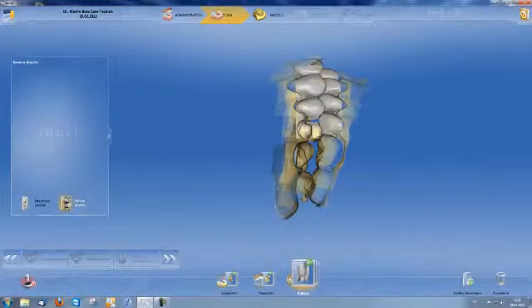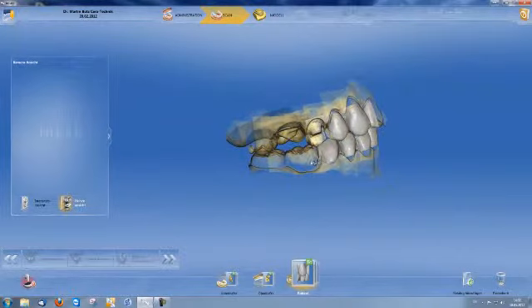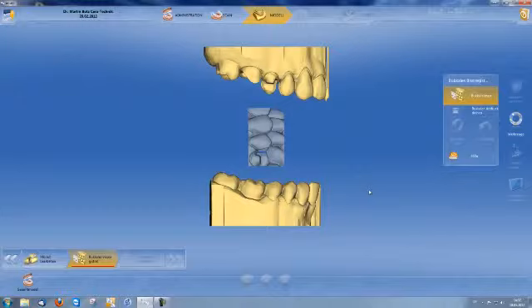As part of scanning, I have scanned the preparation in the upper jaw, the opposing jaw in the lower jaw, and, in the buccal scan, the registration in the articulator in order to simulate the occlusion in the software. Once the scan has been completed, I click on Model and am then in buccal registration mode, in which I assign the upper and lower jaw to the software.